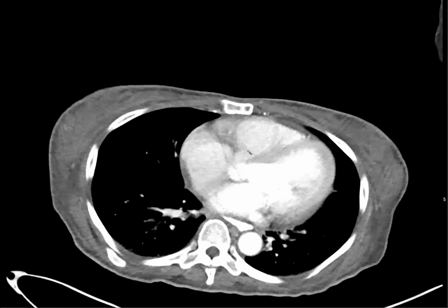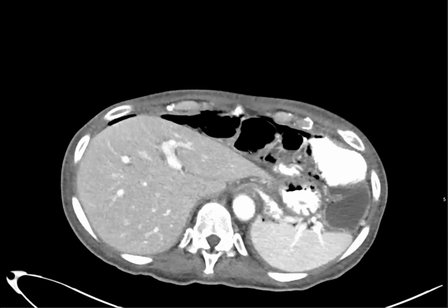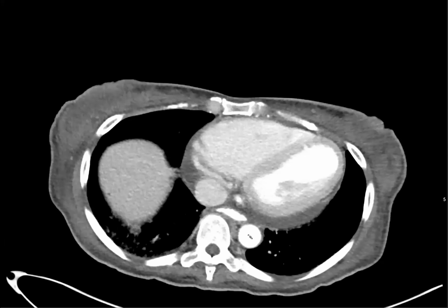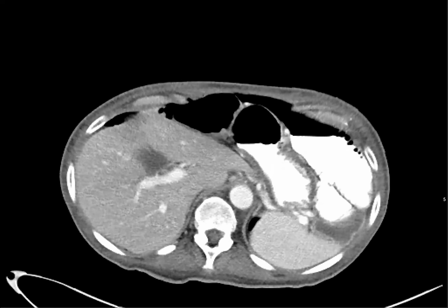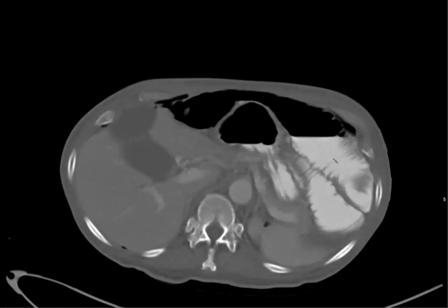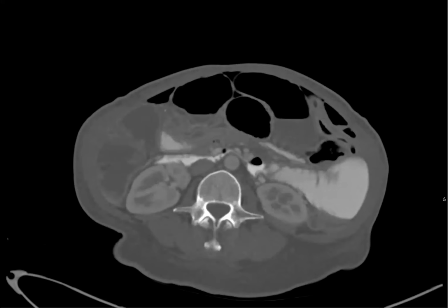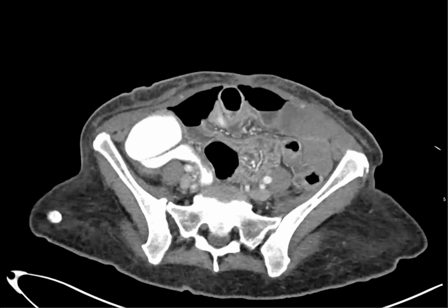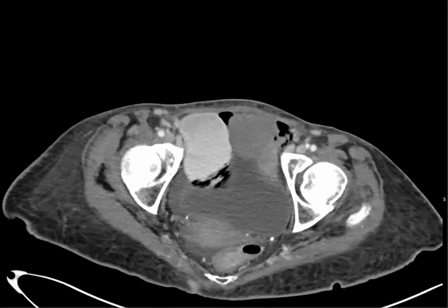Okay, this one, there's a couple of clues. The lung bases are a little bit of a clue here, and the esophagus is kind of patulous here. The bowel is dilated, but maintains its folds. Lots of dilated bowel. Is this hidebound? Yes, exactly.